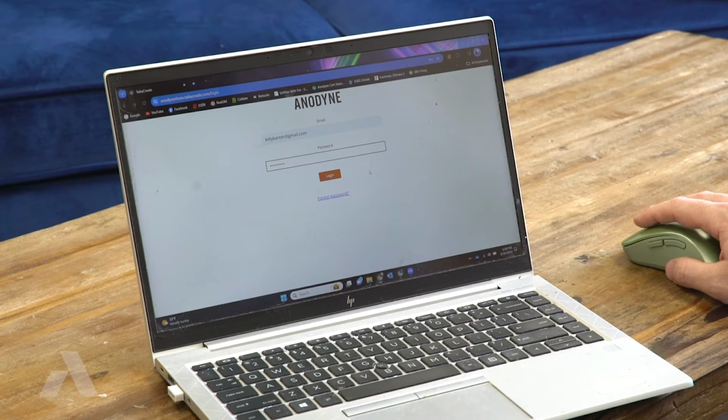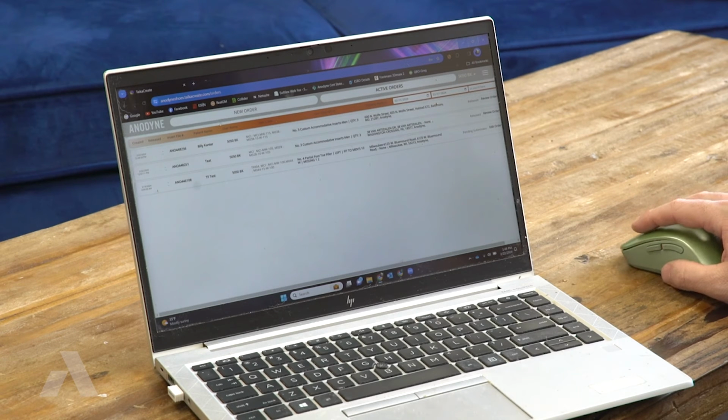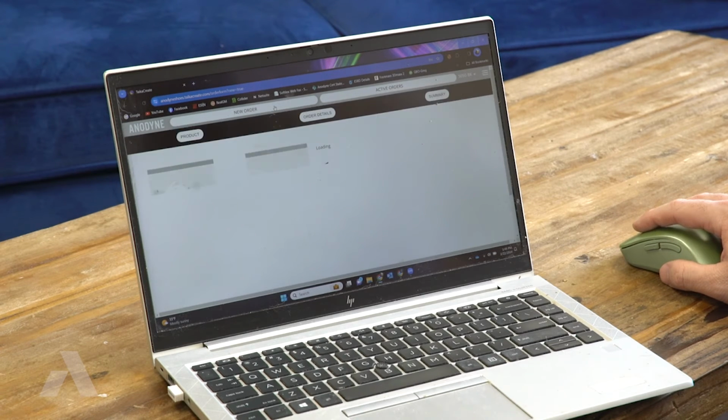Now we're going to look at our ability to upload orders via the PC. We'll still be able to go through and scan using our mobile device, but at least we could start by getting the order detail all set up on our computer. So this site should look somewhat familiar if you've been using the app already. We have our order history, we have our new orders, and obviously the active orders displayed. To set up a new patient, we'll click New Order.